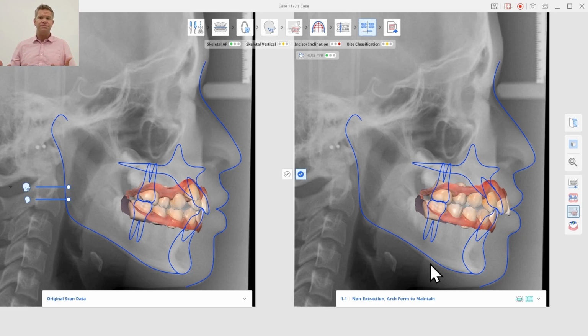So the nice part about having this up before you walk in is the patient can see this, and your initial conversation can be, I see that you're interested in orthodontics. You can see if we straighten teeth, your front teeth are going to flare out. That's probably not a very good option. So let's start exploring what options are available to you.